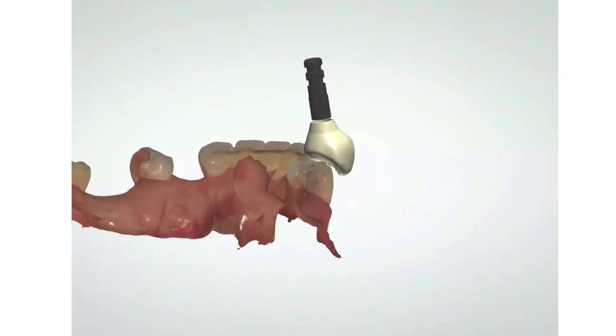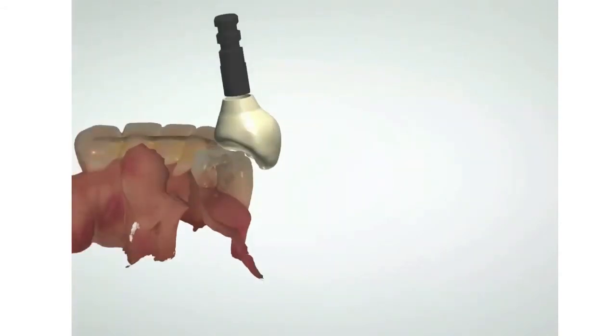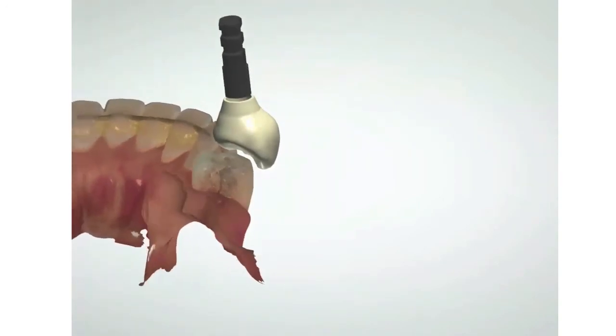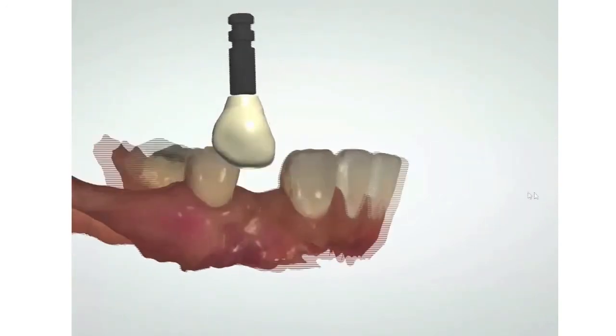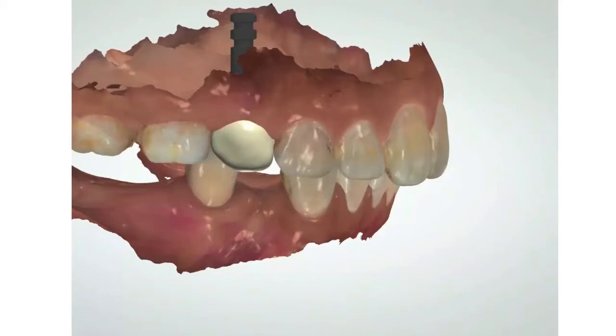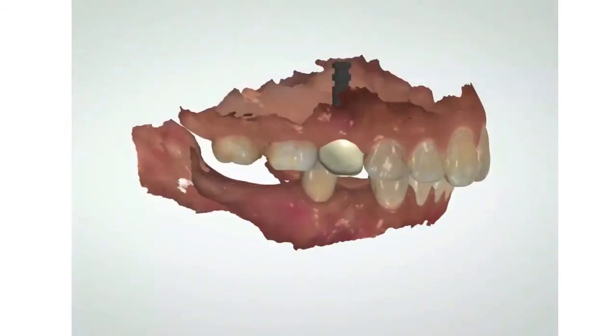We can also design it so that if it's going to be an immediate provisional, we have occlusal relief from that area. See, I want to do as little as possible when I actually treat the patient. I want it to be easier for me. I want it to be easier for the patient. That's my most expensive time. So I want the laboratory to use its tools to create efficiencies for me.